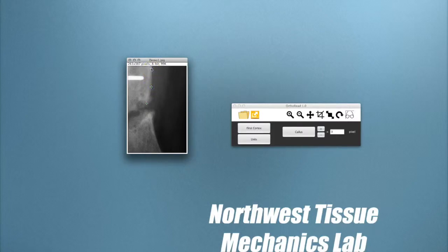Another thing to note is that at least two anchors must be defined to segment a cortex. However, you can use multiple anchors if you wish. Once you finish selecting anchors to define the first cortex, we move to selecting for the second cortex by either right-clicking or two-finger clicking for the Mac trackpad users.